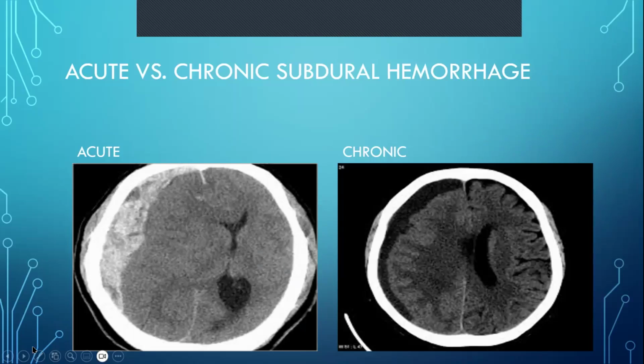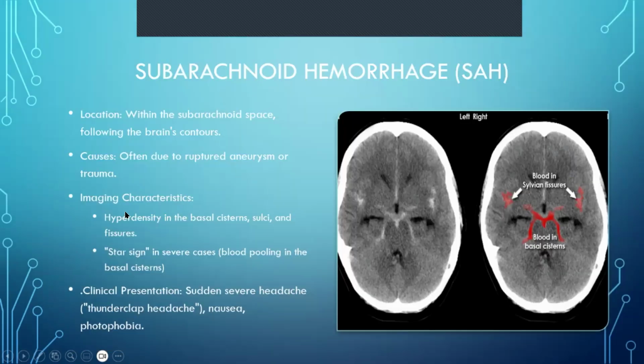Like I say, we're not trying to become masters of the CT scan. I will do more CT scan lectures as the days go on, or as the weeks go on. But for now, as an intro, this should at least give you an idea of how it looks.